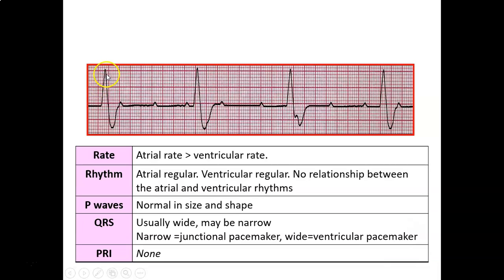Now look at the RR intervals. They are also equidistant, but at a rate of 40 beats per minute, and they are wide, and wide comes from the ventricles. So it means they are coming from the ventricles. The P waves are coming from the atria, but they are not going from the atria to the ventricles, because there may be some blockage at the AV junction.